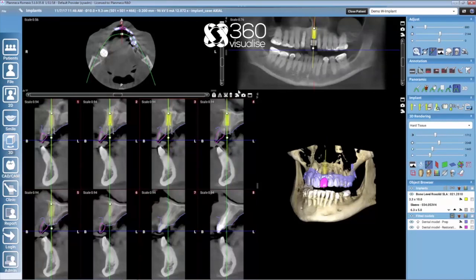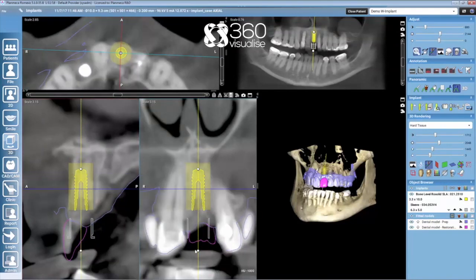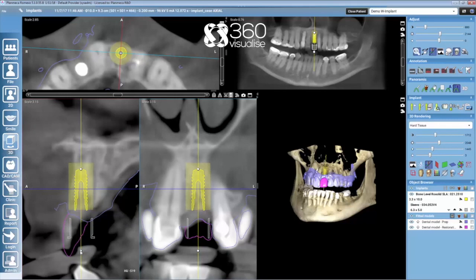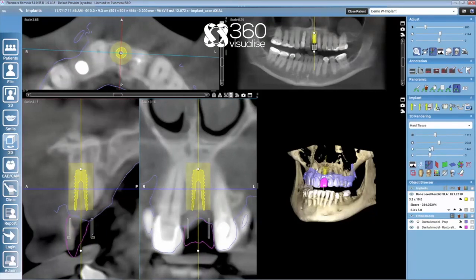and then I will use this implant centric view to place well the implant. So these two slices are always centralized in the implant, and I also see the cuts from the restoration design here, so I have a good overview on how I want my implant to be positioned. Once we have found the good place for the implant, then we can look at the sleeve.